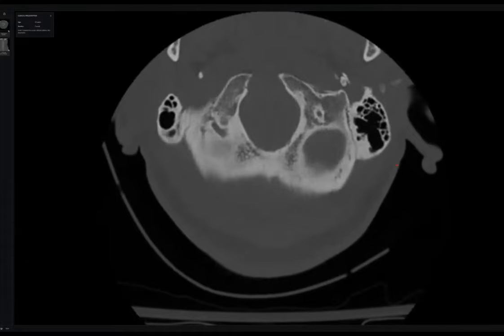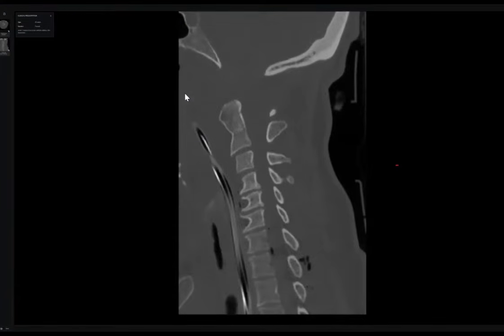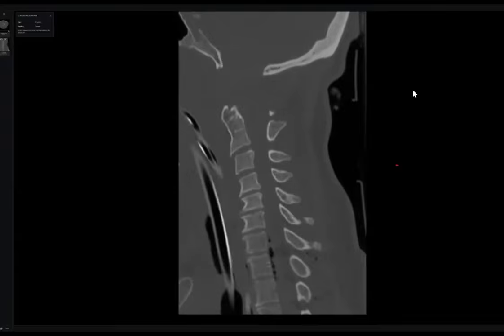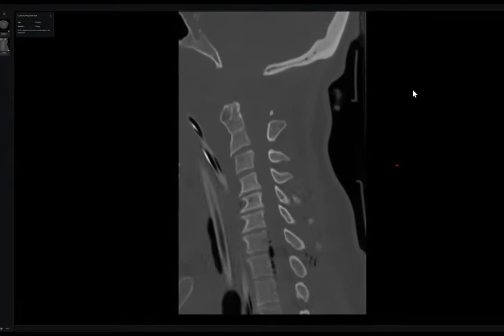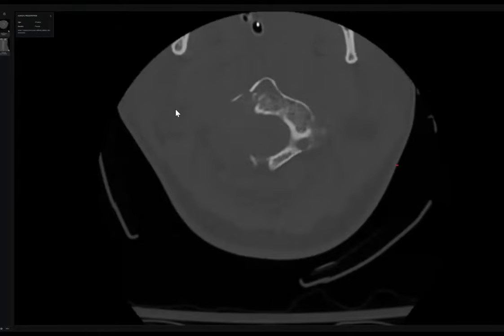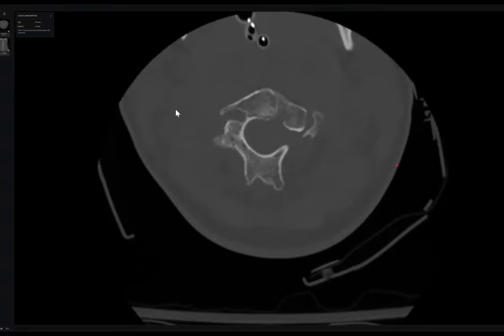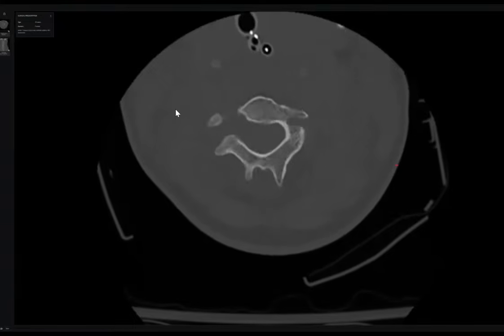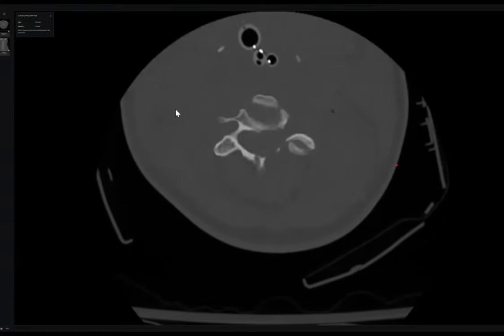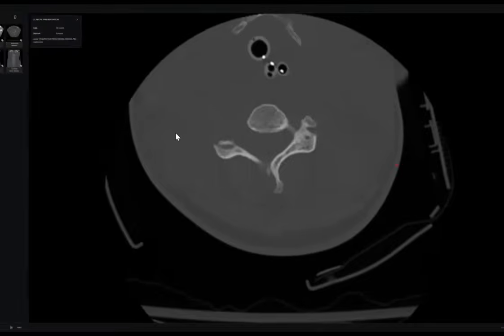There is a very important structure here, maybe the source of the hematoma, and commonly injured in a spinal fracture. Look, what is it? The vertebral artery. Excellent, you should especially do an angiogram. Yes, or you can have a look during the MRI. Thank you, doctor, so much. This is a very important case.